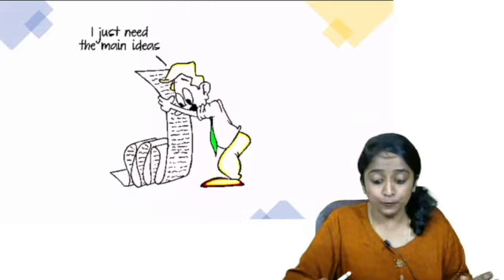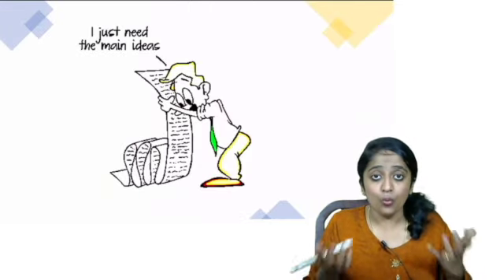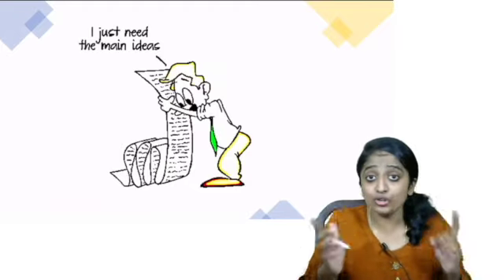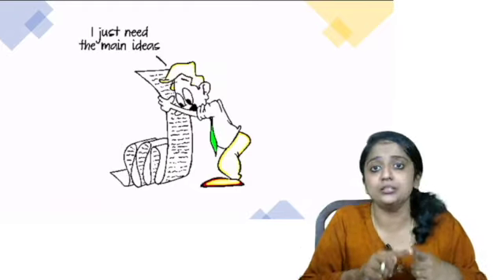So by this stage, I know most of us will be confused, pumped up with lots and lots of information. Chest X-ray finding, CT finding. So if one were to ask you, what have you taken from this topic? As a general practitioner, what should I know? We have already seen the findings, expected findings.